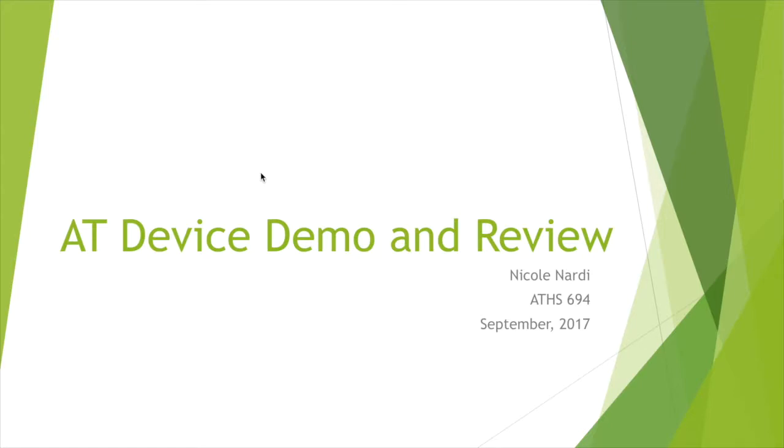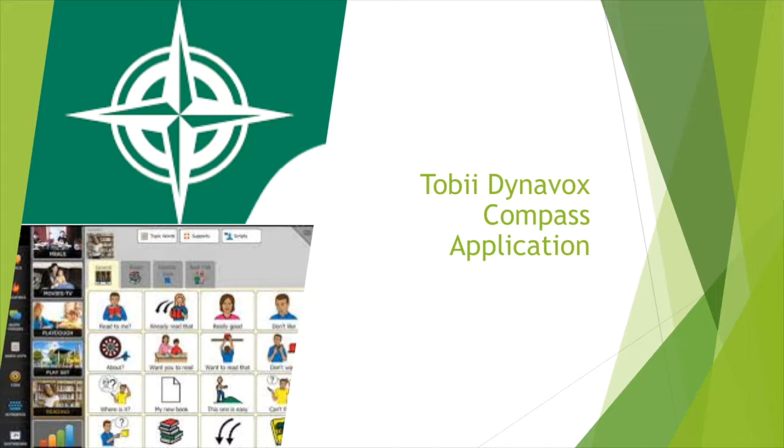My name's Nicole Nardi, and today we will be doing an assistive technology device demonstration and review. Today we will be reviewing the Tobii Dynavox Compass application.